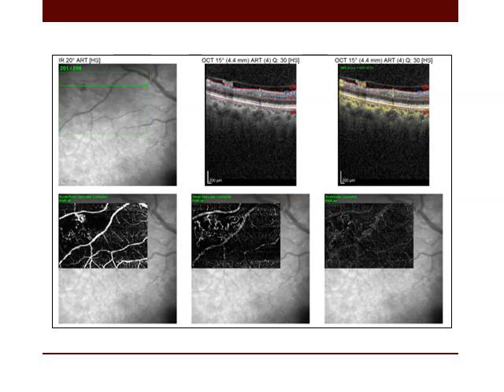In patients with NVD and NVE, if they are accessible within the range of imaging of the device, they will appear and can be detected indeed. However, if they are not, you can't detect them. Now, with the advances in OCT angiography, a panoramic view including 120 degrees of the fundus can be obtained.